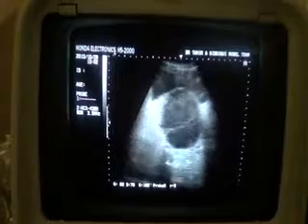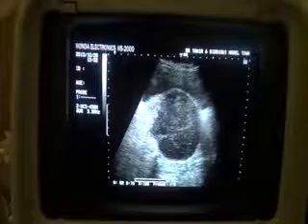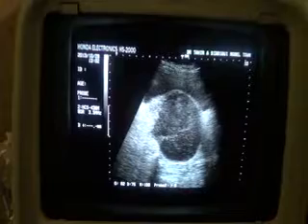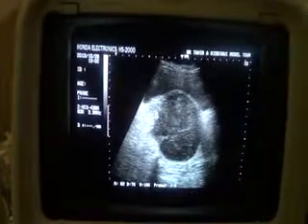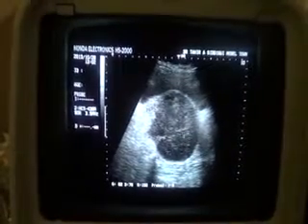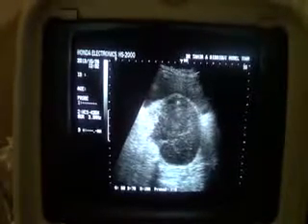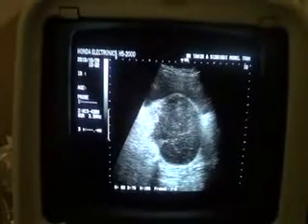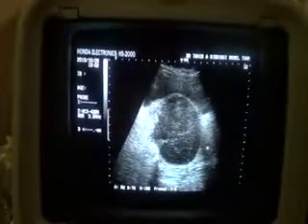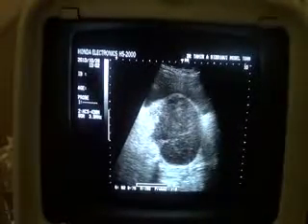One thing to note is that you will see a fluid-filled pocket at the posterior margin of the cystic area in the left adnexal. A tiny septa is also seen. This is the tiny septa. See this area is more liquefied compared to the anterior compartment of the left-sided thick-walled cyst, and the right adnexal cyst shows posterior wall acoustic enhancement and tiny calcification within it. So this is the case of today. Thank you.